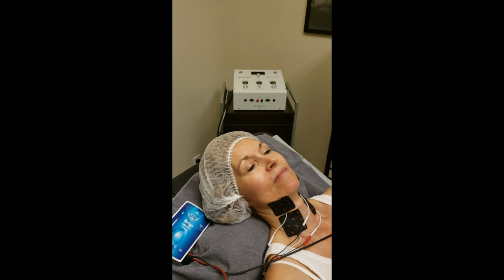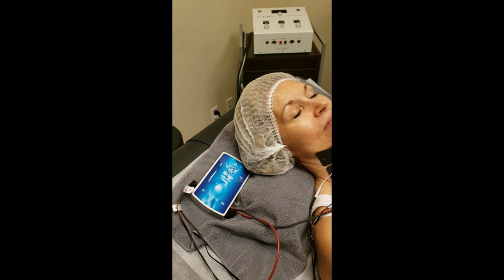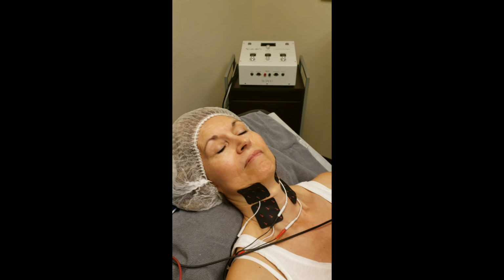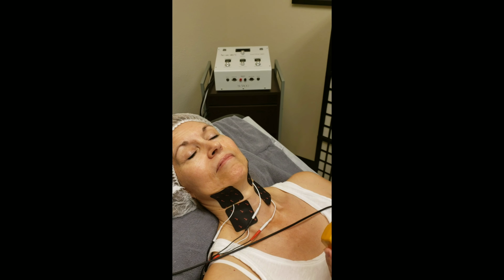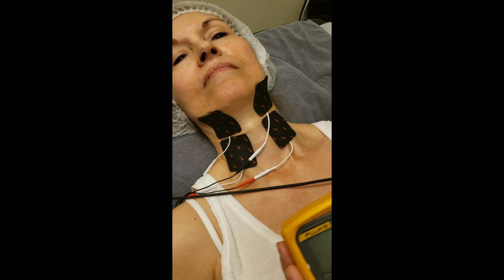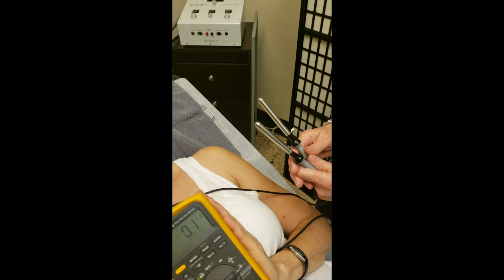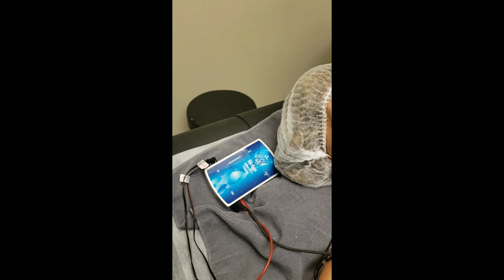So we have a device here that is multiple ports, single channel. And what this demonstration shows is how the current is affected and travels to the actual destination tissue on a single channel system using multiple ports. So we have the face pads connected on two of the ports of this system here. The third port is the probes, and the probes is connected to the third port of the single channel system.